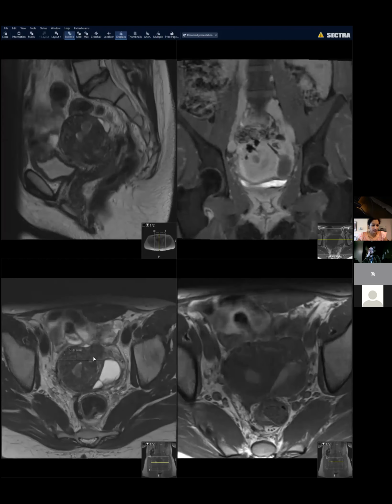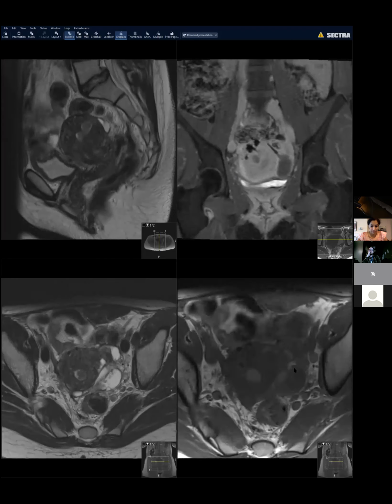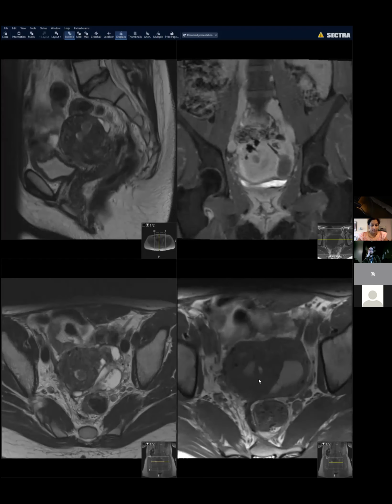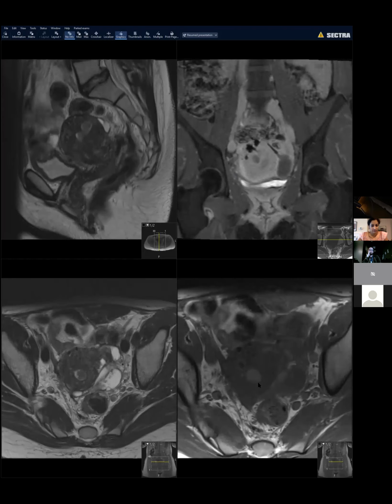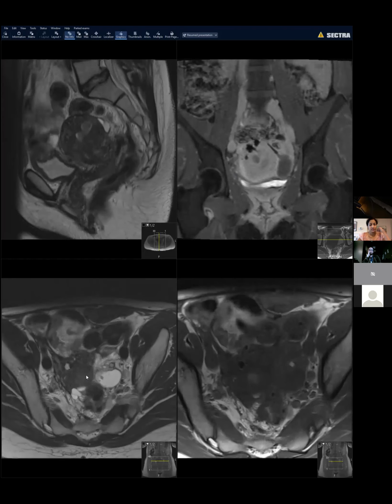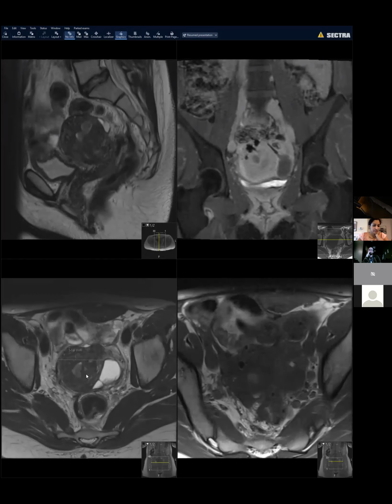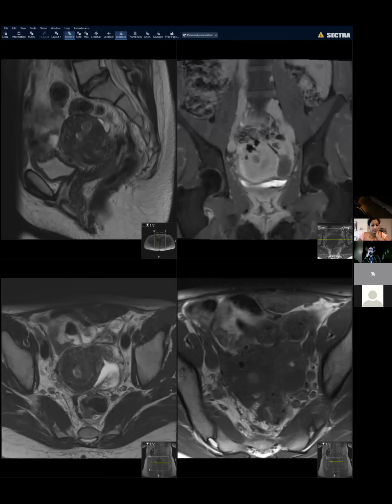This is endometriotic deposits, residual endometriomas, and the left adnexa is T1 hyperintense. And as we can see, this focal abnormality in the uterus has internal T1 hyperintensity. So the confusion in this case came from the op note, which says that they had operated on a right uterine horn, a remnant horn, and that's where the surgical clips are from. So I already see the answer here. Arina said it correct, this is adenomyoma.